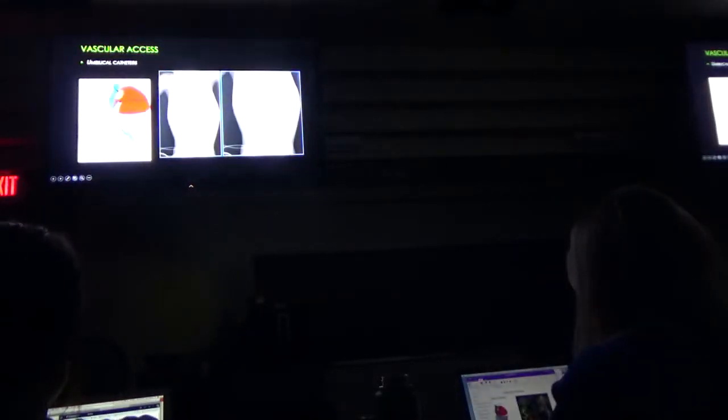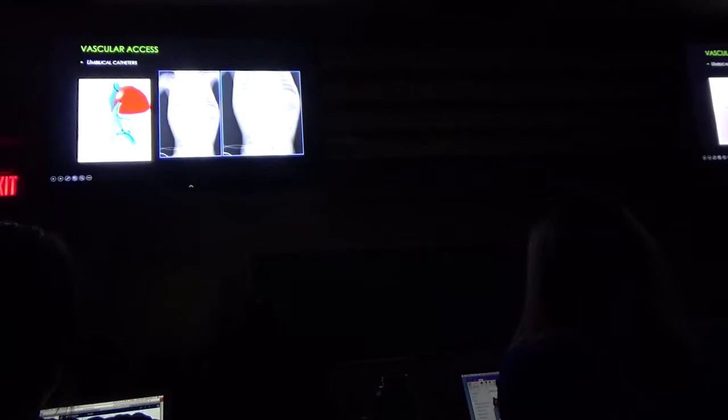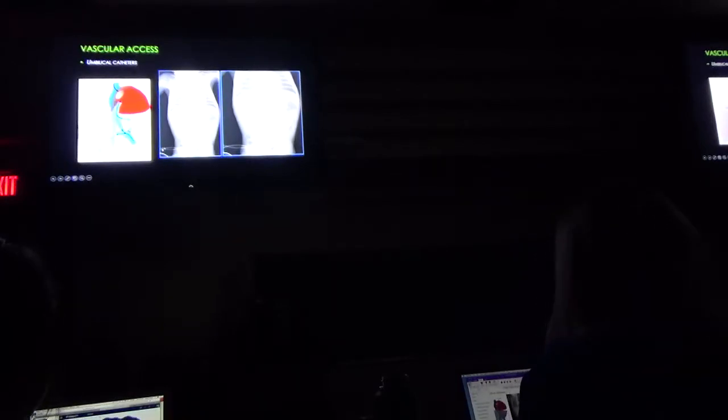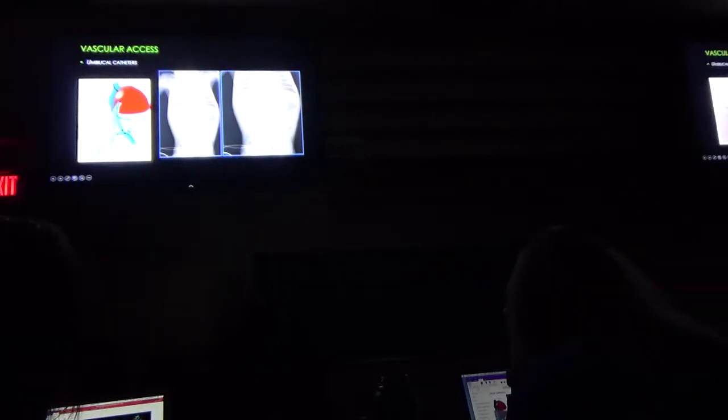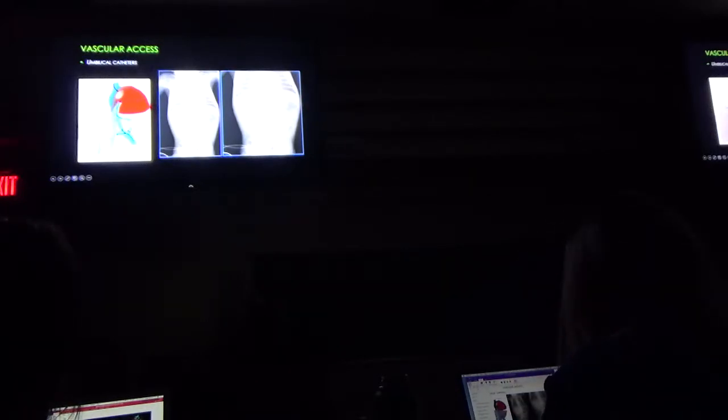That's fine. Here's a picture of it going towards the liver and then doing the 90-degree angle. Okay. And this is what it looks like on the baby. So you've got all of this coiled wire going from the umbilical cord itself, going down first and then up. So they've done both. Oh, you know, I bet they did a venous line first, and then it went 90 degrees, so then they started arterial and had good placement there. So they'll pull this one. So obviously this one went bad into the hepatic portal.